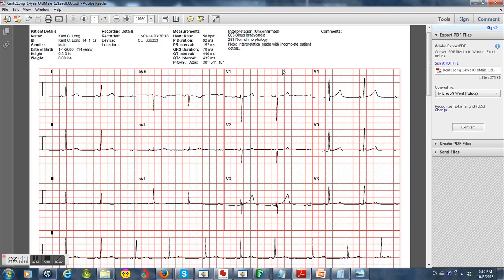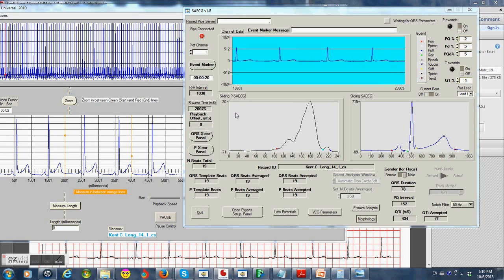And if we look at the ECG more carefully, I don't see really anything abnormal. The intervals are all okay, the axes are okay, the voltage looks okay. There may be a flipped T wave in lead 3, but that's a non-specific finding. And so all in all, we have a normal conventional ECG. Let's go ahead and look at the advanced ECG.